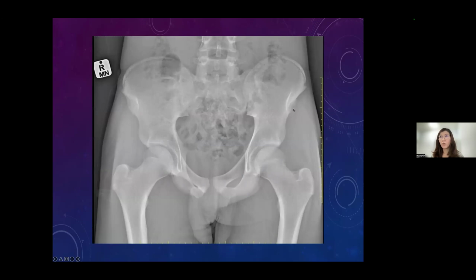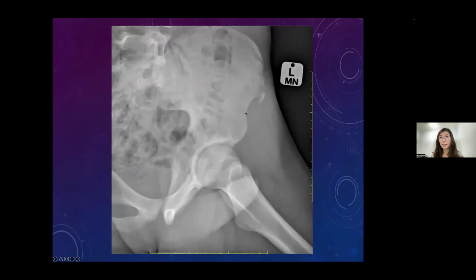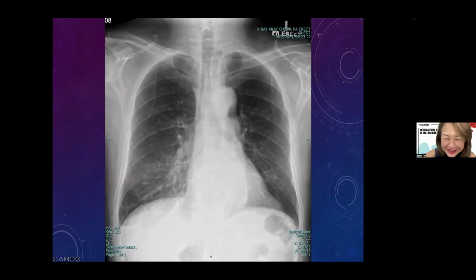So there is an avulsion fracture here, actually at the left ASIS, the anterior superior iliac spine. Do you see the avulsed bony fragment here? Compared to the right side, there's nothing coming up. And you will see some loosening changes here because of the fracture. So this is the next X-ray in the oblique view. Then you will see a clearer picture of the avulsion fracture of the ASIS. Okay. So good guess, Shafika.